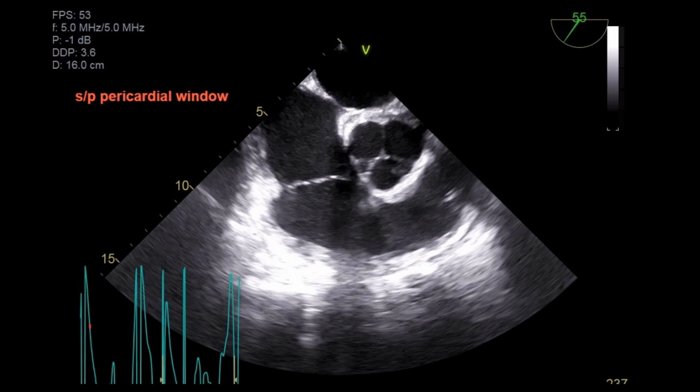Next, why don't we talk about the aortic valve itself, and I'm going to allow you to identify the cusps of the aortic valve. So the aortic valve has three cusps. They're named for the coronary arteries that come off distal to them. So there are two main coronary arteries, your right coronary artery and your left main coronary artery. But as typically there are three aortic valve cusps, that leaves us with what we call the non-coronary cusp because it is not associated with a coronary artery.